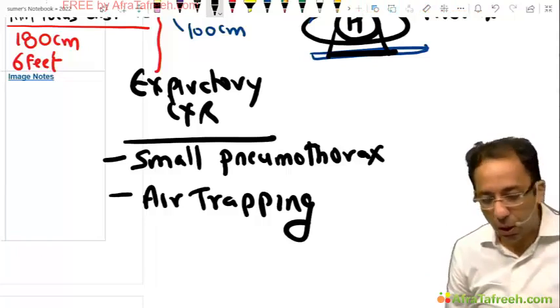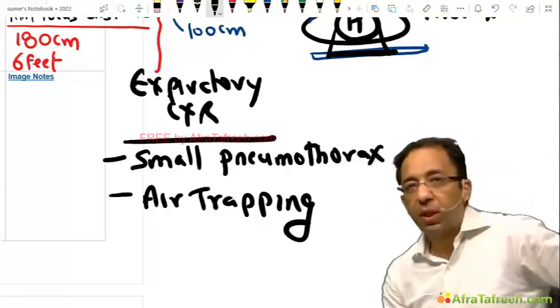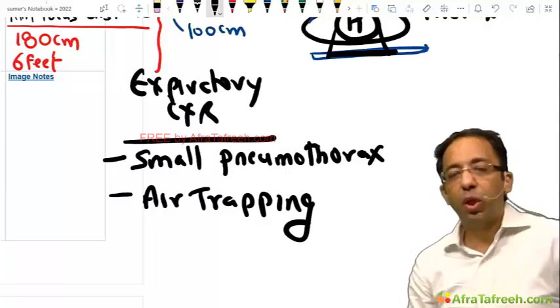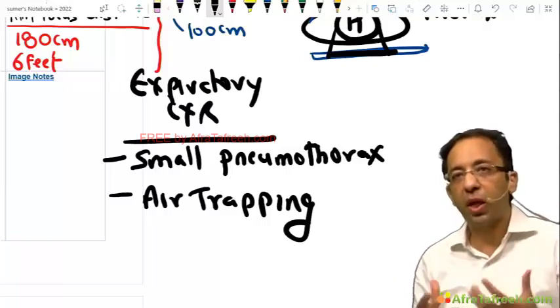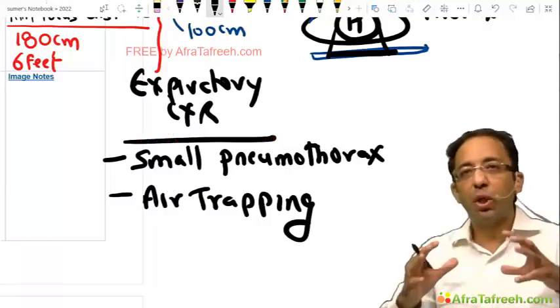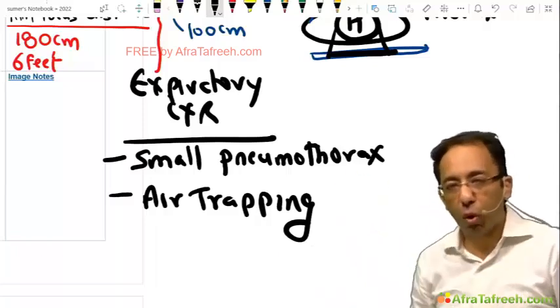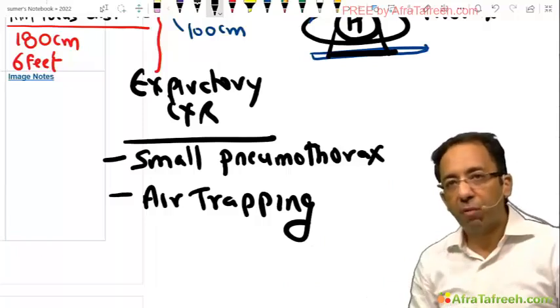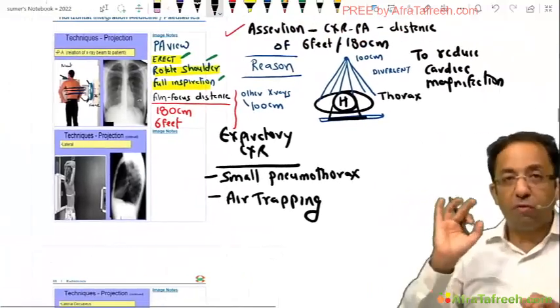Now, once you are clear. Arun is saying it's a diaphragmatic palsy. No, in diaphragmatic palsy you need to look at it in fluoroscopy because there will be paradoxical diaphragmatic movement, Arun. So that is not seen on a static X-ray. You need to do something dynamic. So we will do a real-time X-ray called fluoroscopy to look for the diaphragmatic paradoxical movement. So far so good.